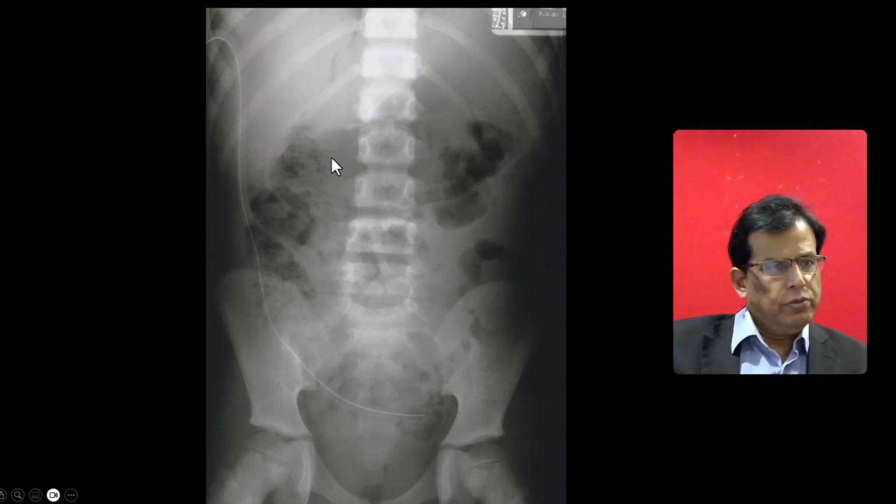Then I can see air lucencies overlying the liver shadow, in the 11th intercostal space on the right side. You can see the gastric shadow in the gastric lumen. The large bowel appears fecal loaded. There is some component of spina bifida in the L5 vertebra. So I see a drain, an external tube, and air lucencies in the region of the liver, and a spina bifida.